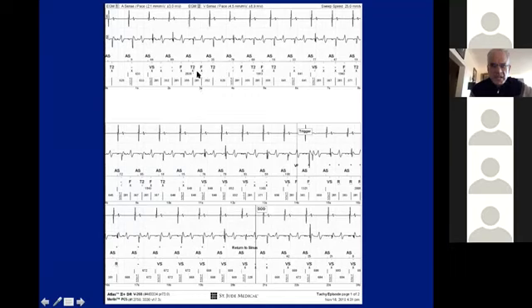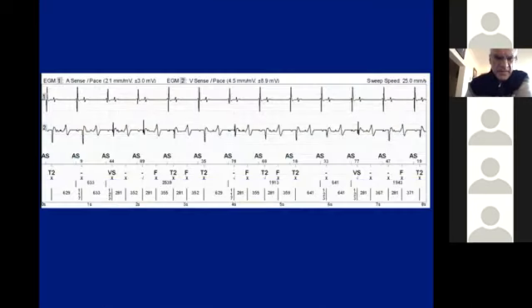So what is that an example of? This is T wave oversensing. That's another thing that can result in inappropriate therapies from the device. And this is the same thing enlarged, so you can see it more clearly. All right.